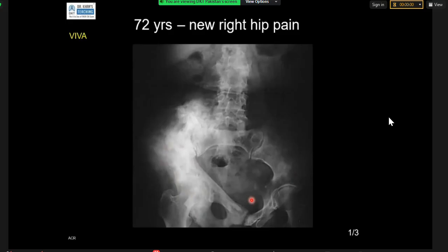I can see cortical thickening and trabeculation involving the right hemipelvis of this patient. I can see there is also sclerosis or matrix in the area of the sacroiliac joint. There is also involvement of the sacrum. In my routine practice, because this is a known case of Paget's, I will compare with the previous images, and because of the clinical history of pain, I will think about malignant transformation into osteosarcoma.